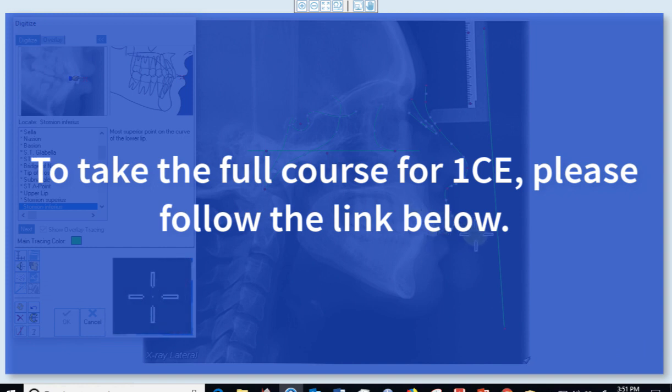Well, one thing you could do is put this point more anterior, and then simply hover over it until you see these four arrows, and then you just drag it. So I put my point somewhere else, and then I drag it. Let me show you how to do that. Then you can go to the next point, which is lower lip, the most anterior point on the curve of the lower lip. Again, if you can't see it for some reason, you could put it on the side, like I just did here, and then you can drag it like that.